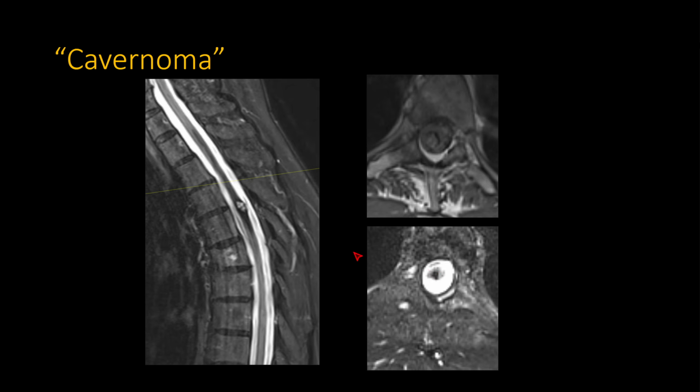Now I've put this in quotation marks because we typically see an image like this and consider it pathognomonic of a cavernoma. It probably is not quite as pathognomonic as we think, because this particular case had surgery, had this thing excised, and under histopathologic assessment, the diagnosis was a hemangioma. And cavernomas and hemangiomas are pretty different. A cavernoma is a vascular malformation, while a hemangioma is a true benign neoplasm. But regardless, it is a benign vascular process, and I think that's the important thing.